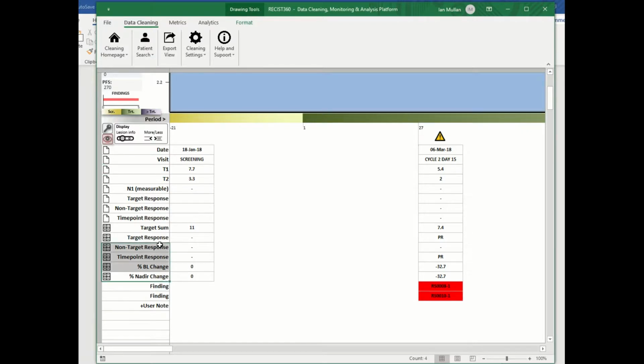There is, quite naturally, a lot of information displayed to the end user. This information is required for the program to identify data discrepancies, but it doesn't mean the end user has to see all of it. We will see how to do this shortly.